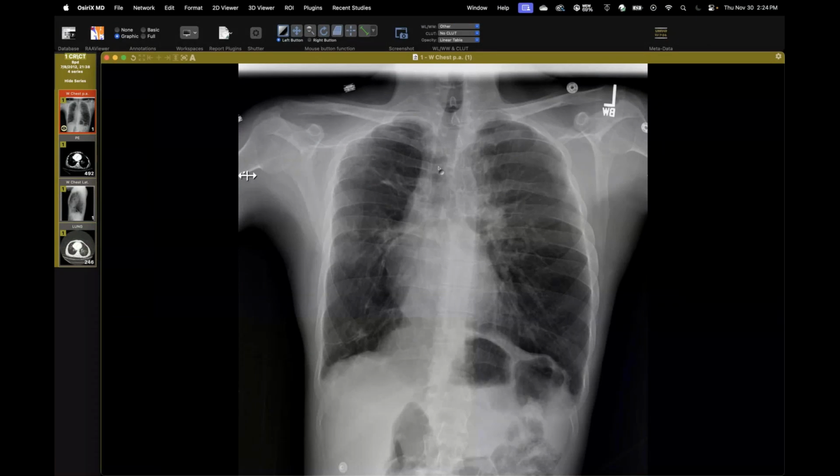So you can see on his radiograph, on the frontal radiograph, that his lungs are not normal. The right lung is small. It's kind of hyperlucent. There's these strandy things on that side. Left lung is a little lucent in the base, and maybe some hyperinflation.